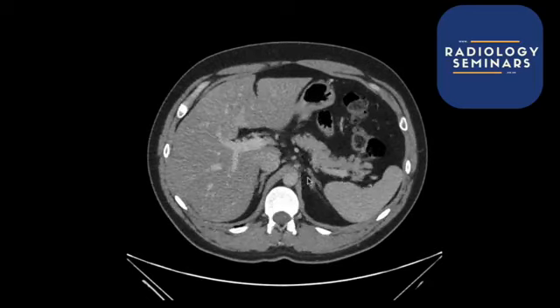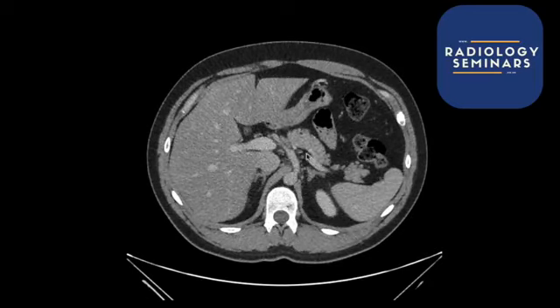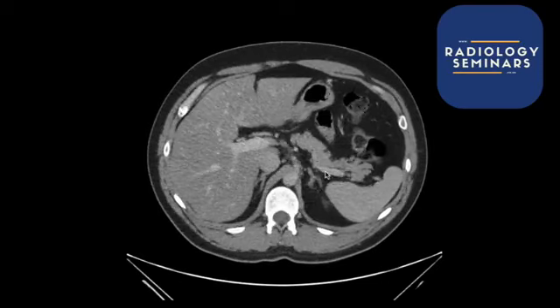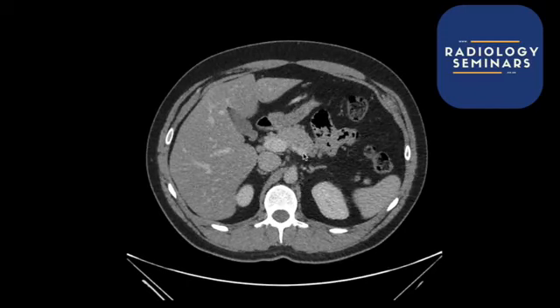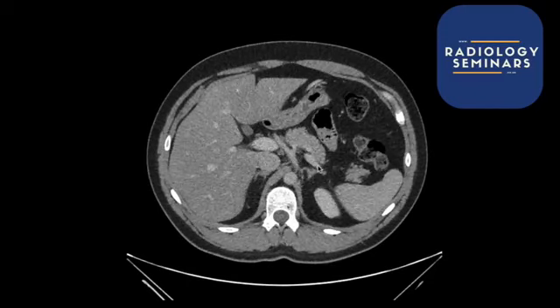Important piece of anatomy when you're looking at pancreatitis is that you've got this vessel here. You can see that vessel. Can anyone tell me what that vessel is? I'll give you a few seconds. Can anyone tell me? That vessel, I'm just going to point it out again, going behind the pancreas, there. So not very well drawn, sorry. But hopefully you guys can see what I'm trying to point at.